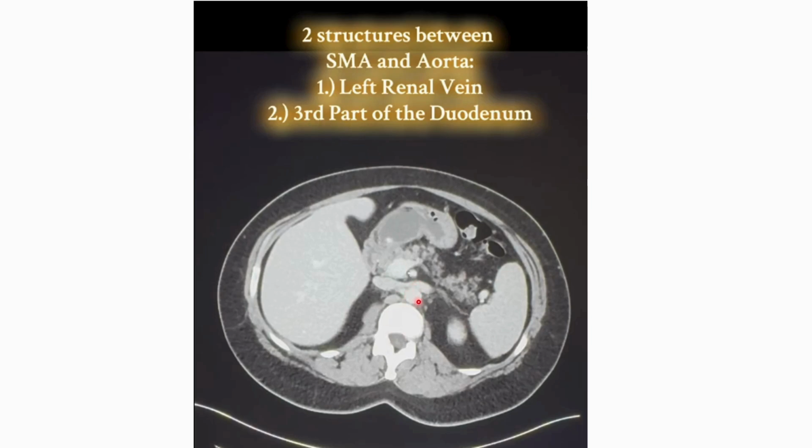So we have big red, the aorta. If we had a couple slices up, we would have the celiac axis. But we're at the second vessel, we're about L2, L3. This is the SMA. And we will have big blue over here. That is our IVC. So we have big red and big blue, and SMA. And then what is to the right of the SMA?